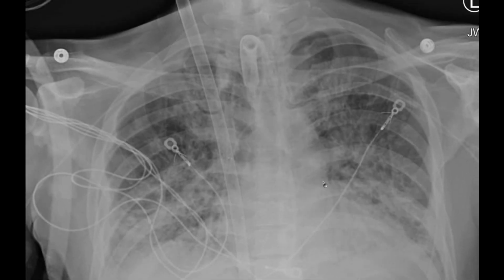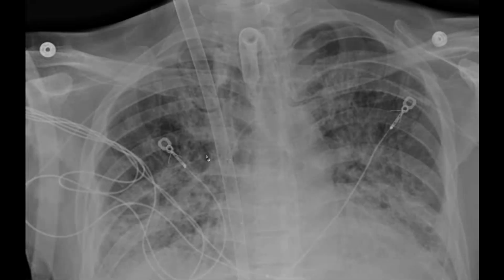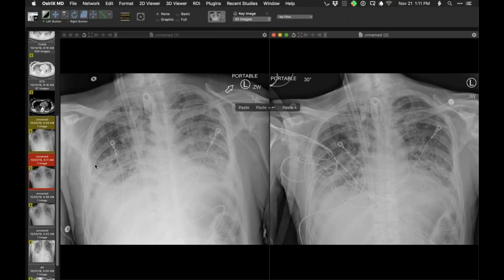And I'm actually just going to point to the findings. So you guys feel free to make any comment. But in this location, here is one finding, and it's related to this. Right there. So that is a thin stripe, a couple millimeters, but that is the right tracheal wall. And we see it as a white stripe along its length because there has to be air both within and outside of it. So that is a double wall sign in relation to the trachea there of pneumomediastinum.